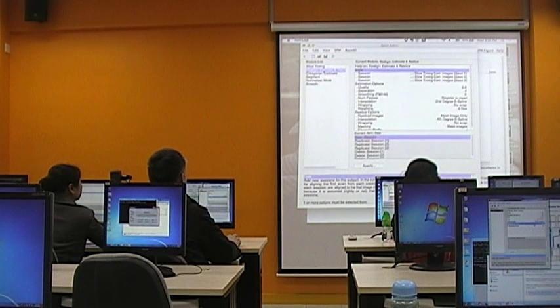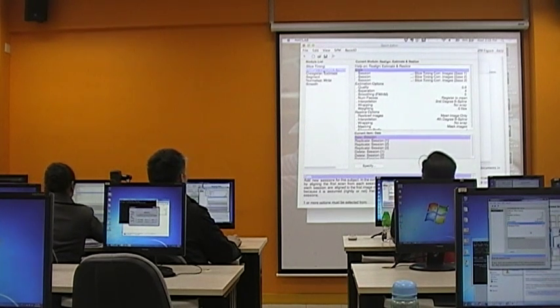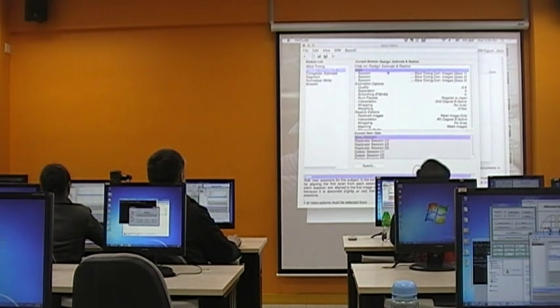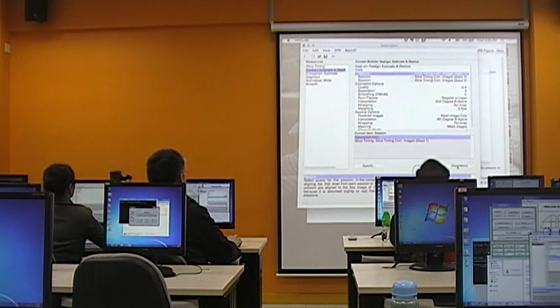And then in realign, when we want to do head motion correction, remember that when we set this up, we want to use the output from the previous step as the input of the current step. So you click the dependency button.